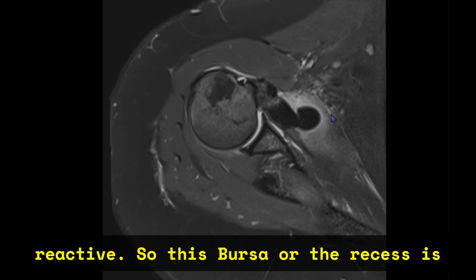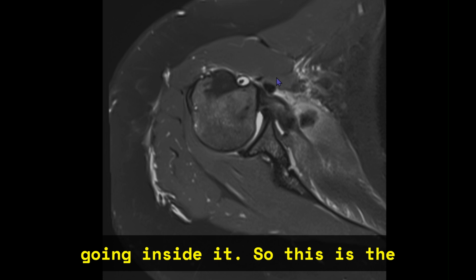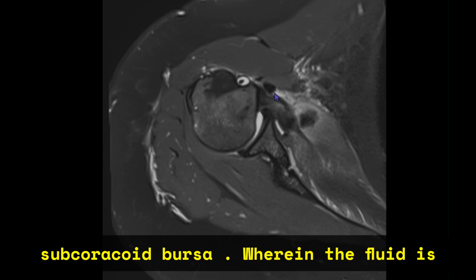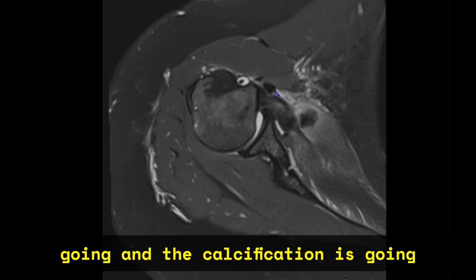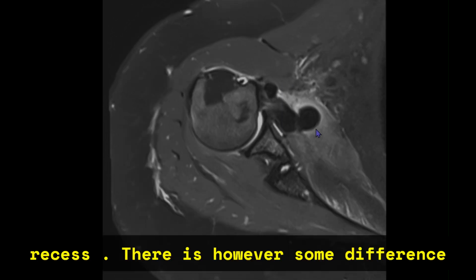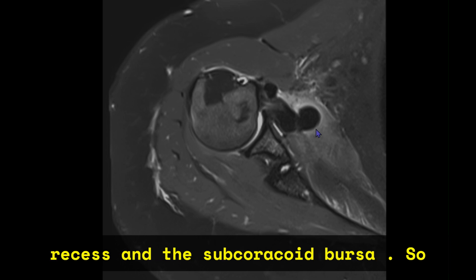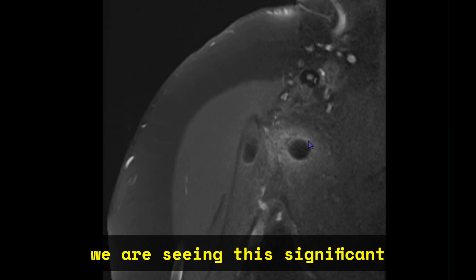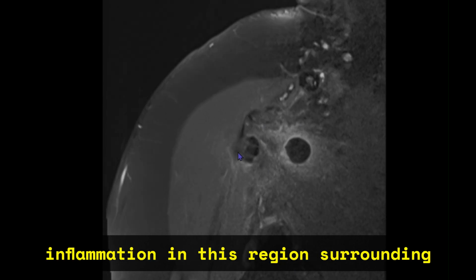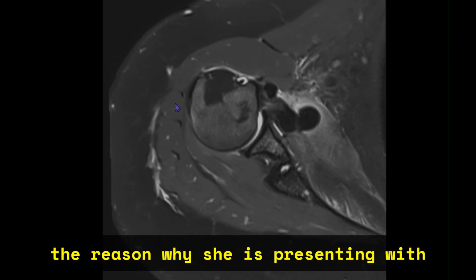This bursa or the recess is reacting to the calcification which is going inside it. This is the subcoracoid bursa wherein the fluid is going and the calcification is going, and this is the subscapularis recess. There is, however, some difference in the nomenclature, but the generally accepted terminology is the subscapularis recess and the subcoracoid bursa. So we are seeing this significant inflammation in this region surrounding the extruded calcification, and this is the reason why she is presenting with her pain.